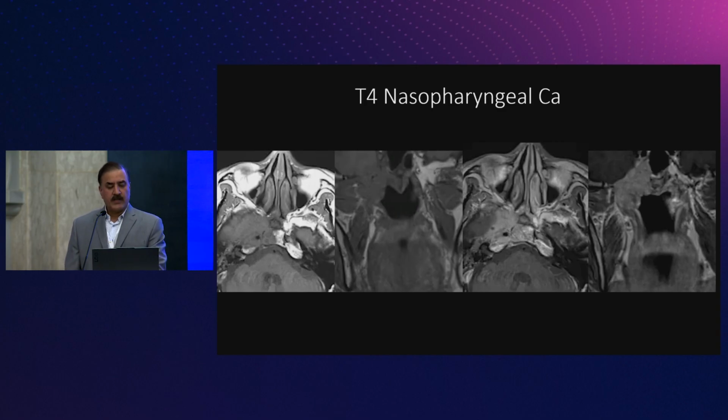Okay, moving on to the T4 now, and T4, as I said, is intracranial, perineural spread, orbits, hypopharynx, and extension laterally way lateral into the parotid gland. So here you can see that it is involving the floor of the central skull base, involvement of foramen ovale. It is creeping up. It is involving the inferior sulcus of the cavernous sinus.